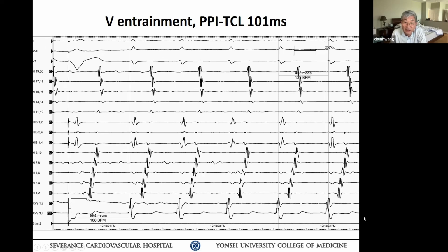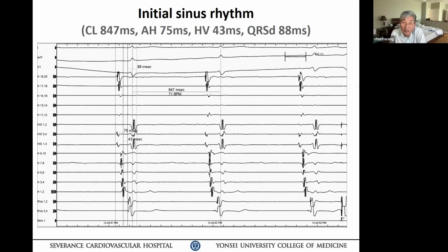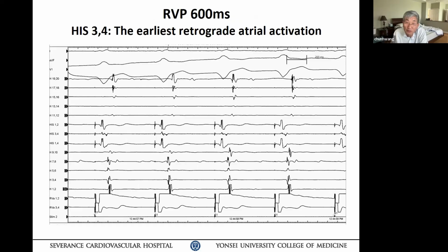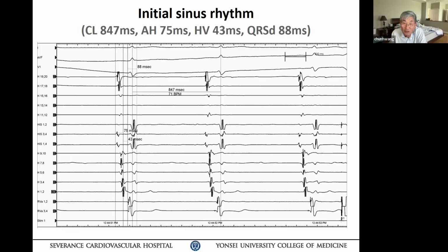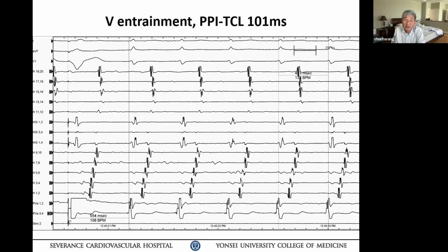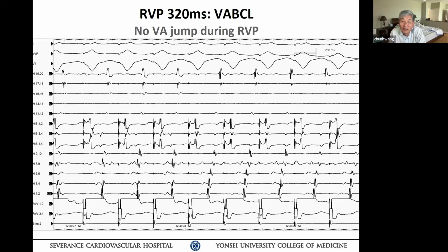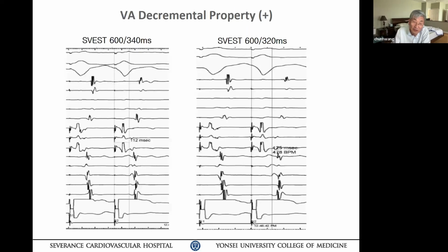And here, I think it's the same story. You give a V extra stimulus, a little bit of variation, but not too much. Keep going. There's one last slide I want to comment on. Keep going. Okay, let me go back there for 1 minute. One previous slide. Okay, not this one. Keep going. Tachycardia, the same. Keep going. It's still good. Okay, keep going. Forward, please. Okay, forward. Oh, go back there for a second, the V pacing.